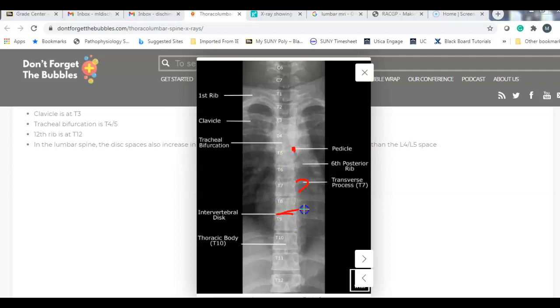And then you can't see the cartilage. You can see the discs here. So you can't see them super, super clear, but you can see them from step to step. So if you're looking at from one level to the next, you would see it get slightly thicker as it moves down, and you don't see any on here that look a lot thinner than other ones. If you saw one that's a lot thinner than the others, they might have a herniation there. Herniations in the thoracic spine are much more infrequent. We don't see it quite as often.